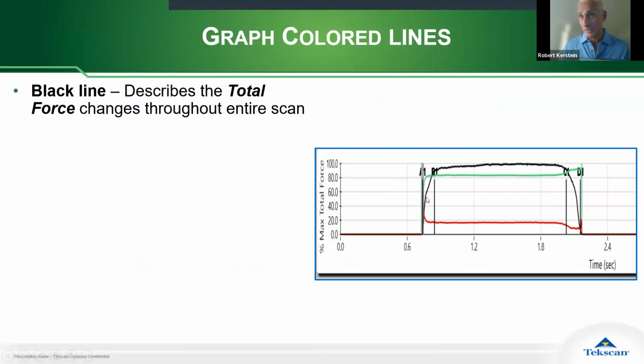Here their forces are going up. Now the forces are slowing down. Here they reach static intercuspation. That's where the B line goes. We'll talk about that in a second. Static intercuspation is where the forces rise quickly, but then they slow down. And that leads to maximum intercuspation, where the person squeezes to full contact.